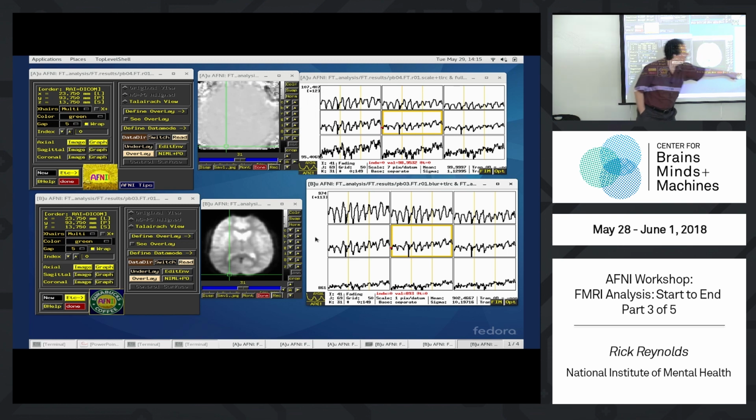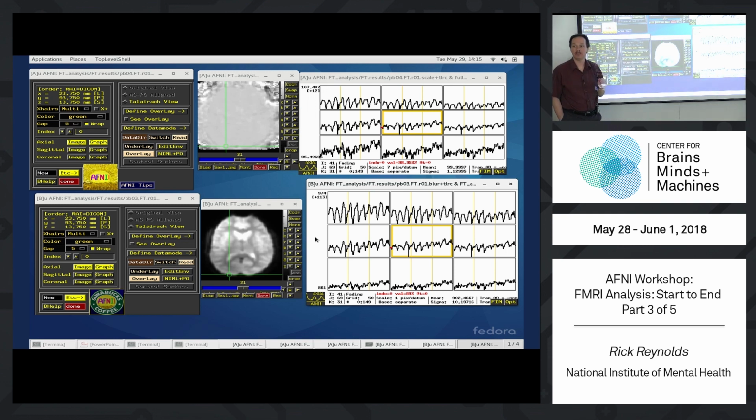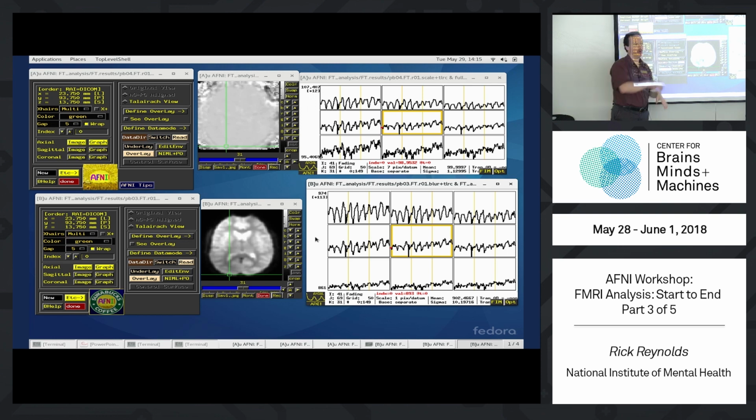Back here, we're 893 here, so we're hovering around 1,000 here. And outside the brain, we're probably hovering below 100. So there was a very clear gradient from brain-ish area to non-brain area. Here, everybody has the same mean. And so we've wiped out that contrast. Optimally, there'd be no contrast here. Well, some contrast from a bold response, but that's about it. Now, but how about the curves? Yeah, the curves are unchanged.